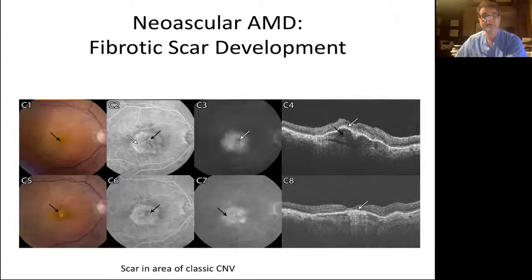A pseudohole involves typically macular pucker or an epiretinal membrane with distortion around the fovea and gives the appearance of a hole, but it's not a full thickness hole. And therefore, the patient often has good vision. In many of those cases of a pseudohole where patients have well-preserved vision and only a mild macular pucker, those patients can be observed.